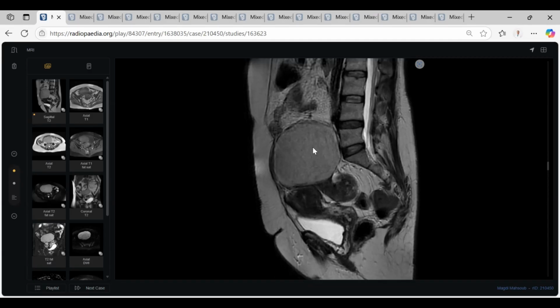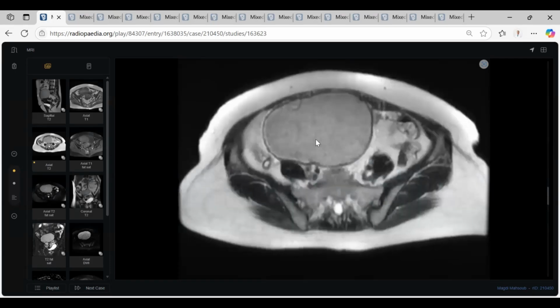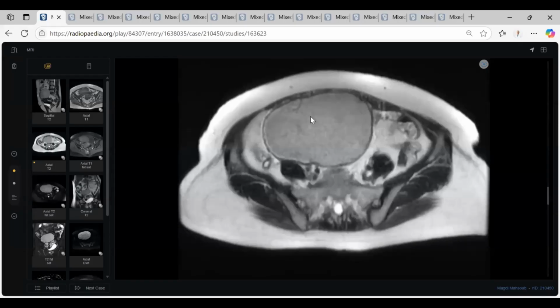Doctor, can you hear me? Yes, sir. In any type of ovarian torsion, you find some edema in the ovary because of ischemia. You can consider this slightly bright signal as part of edema, because due to this torsion there is ischemia for the whole left ovary and the left fibroma.